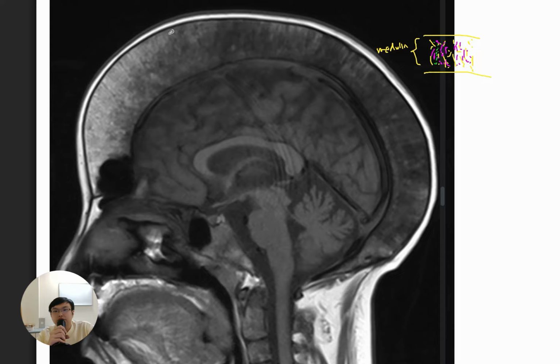Even in this patient, you can still appreciate that there is some portion of the marrow signal that is relatively dark, so I would expect that is more hematopoietic component, while you can still see some interspersed slightly hyperintense signal, which I would suspect is more fat component.